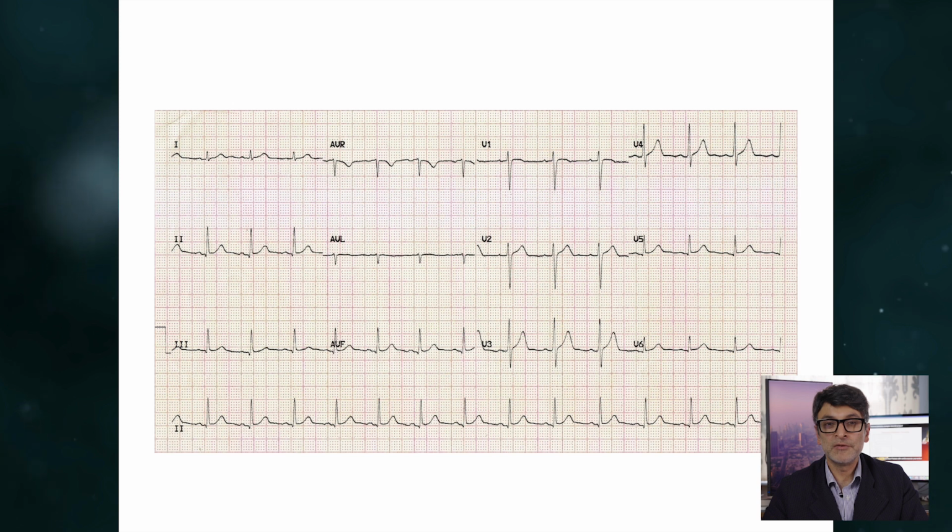Now I'm going to stop you here. If you said left or right, then you've got to look at it again. In this ECG, the QRS is narrow, so there is no bundle branch block. This is a narrow QRS. So you've got to make sure that if you're calling it left or right, you have to have a broad QRS to start with.